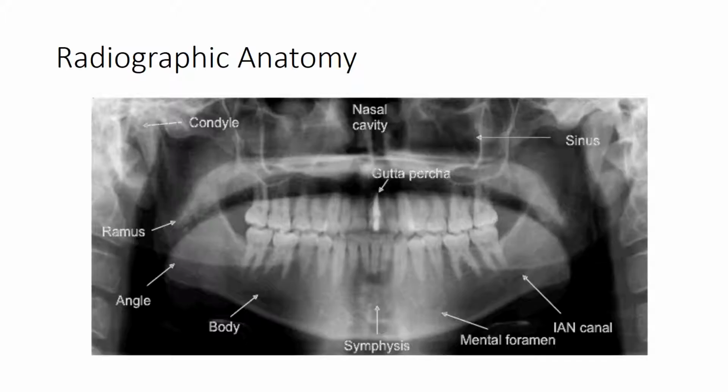The panoramic radiograph is commonly ordered in the hospital setting, and therefore a basic understanding of the maxillofacial anatomy on this study is helpful. This diagram is fairly self-explanatory. One point I would like to make is that of the appearance of gutta percha, a common root canal filling material that can be seen as a linear or curvilinear radiopacity within the root system.